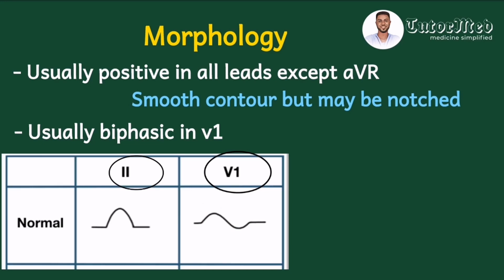And so the first component, which is the positive component, represents the right atrial depolarization. And then the terminal negative component represents the left atrial depolarization. Now, because these components represent the different atria, this makes lead V1 the most suitable lead to assess for individual atrial anomalies.